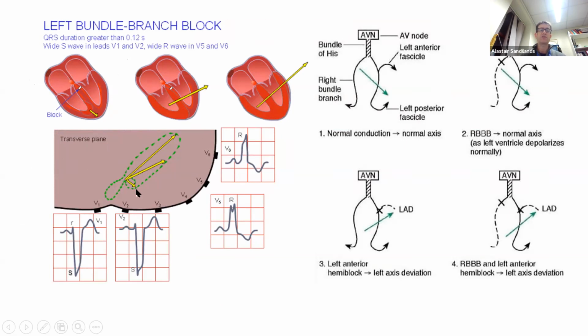So we have a very small segment going towards V3, going away from V1 and V2, or perpendicular anyway. Then the right ventricle depolarizes, getting ready to go towards the left, and therefore this is the deflection going towards most of the lateral leads. And then lastly, the full depolarization of the left ventricle is the greatest deflection going towards V6 as the most positive lead. Okay, so this is left bundle branch block: negative deflection in V1, normally a positive deflection in V6.